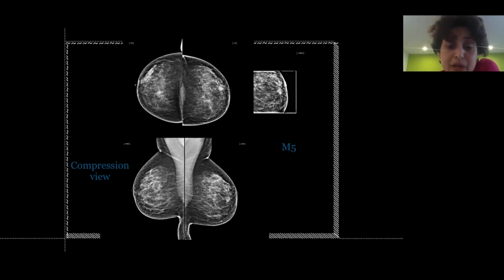and biopsy, the pathologist will classify. So that's an M5 lesion in the left breast, which says that it is a cancer. It's a spiculate lesion. If you were to describe it, you can say that this is a spiculate lesion measuring approximately 15 millimeters. It's sited in the retroareolar region as seen on CC view and on the MLO view, approximately 10 millimeters behind the nipple.